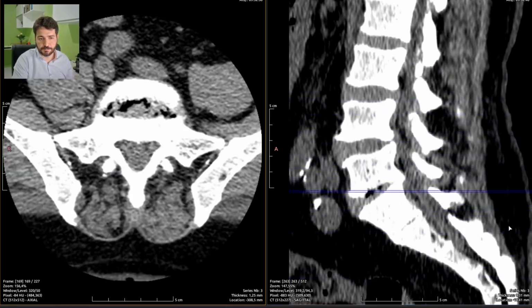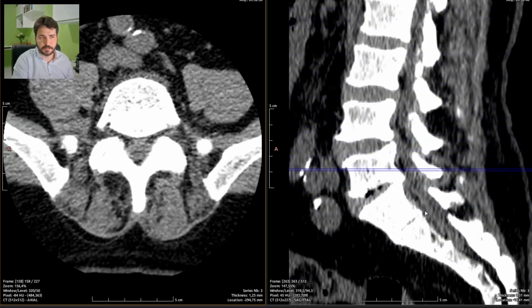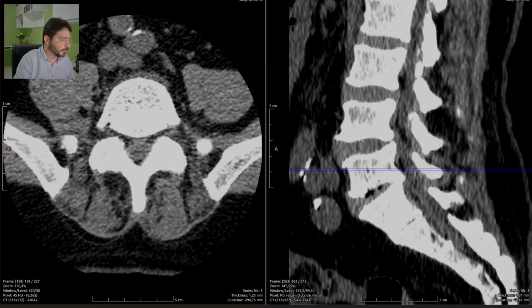So this is a very painful, very severe disease on this old man, this 72-year-old man. So this is already here on my report, because I grabbed a template for old people's severe damage lumbar spine. Let me just review it and summarize this report.